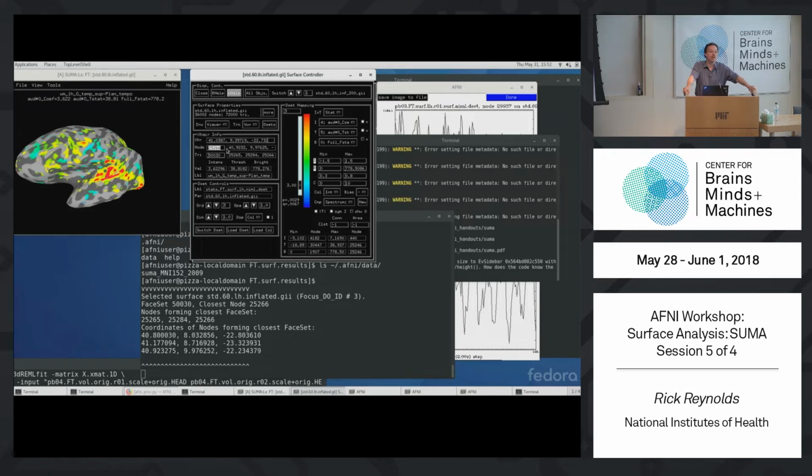What does that mean across my subjects? That means this anatomical location across subjects. That does correspond across subjects. That node index is supposed to be the same place across subjects according to the FreeSurfer spherical registration process. But the XYZ coordinates don't tell you anything.